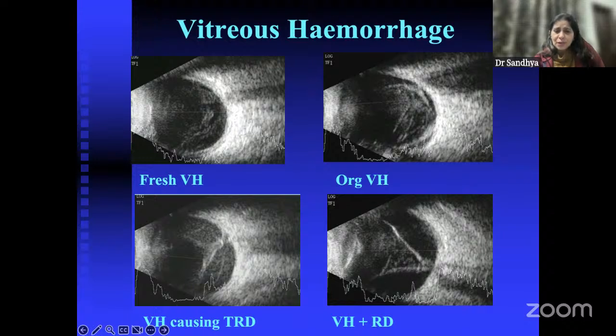And if you see the corresponding A scan spikes here, this is a higher spike, okay? This is the higher spike because this line is now passing through the retinal phase. So this is how you know it's a retinal shadow, because the A scan spike is a little higher in the retinal shadow, whereas at this intersection with the PVD, the spike is a little lower.